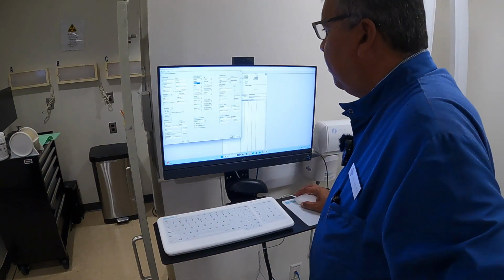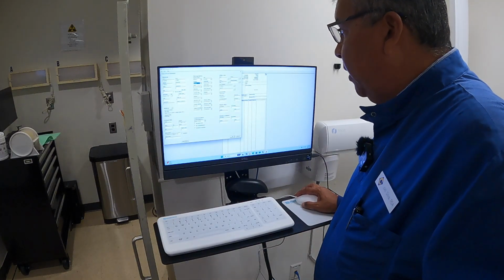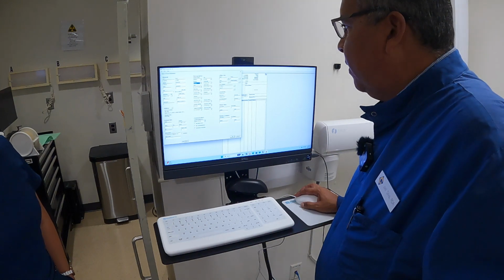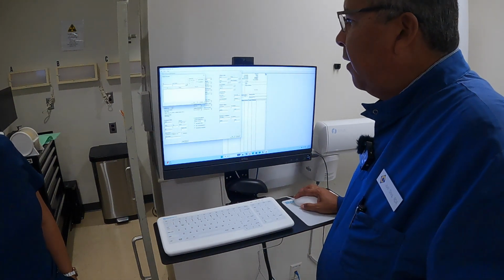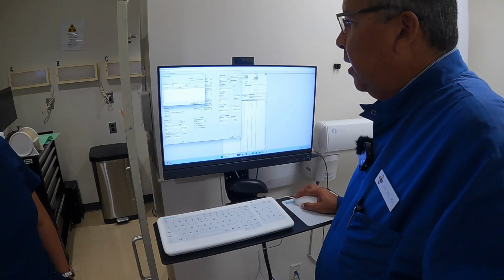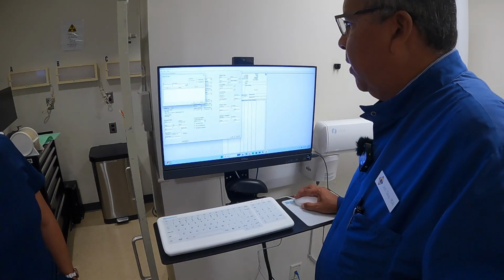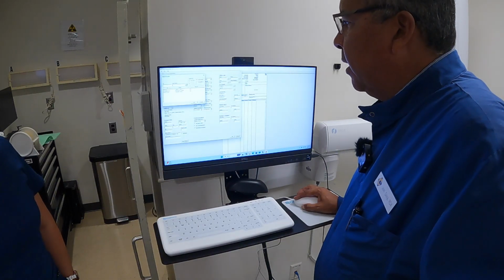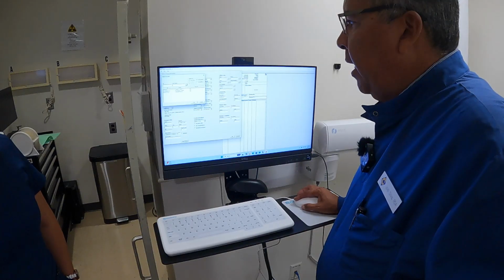So when it comes to the provider information, our clinic is DA, and then we're going to click on the side menu for that, for PROV1, and then we're going to click on there. Nothing really comes up, so we have to click on all providers, and then press OK. Oops. Let's go back here, all providers, and then we're going to click on this little side menu right here, and then it'll pop up. And then we are CYPDA right there.